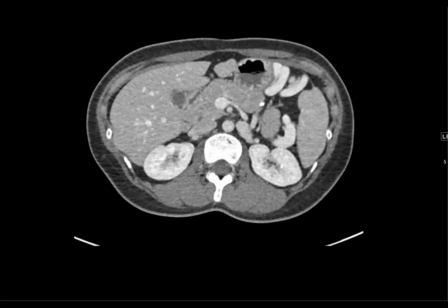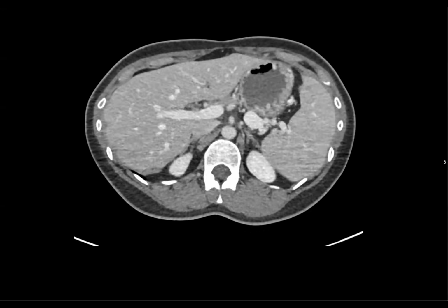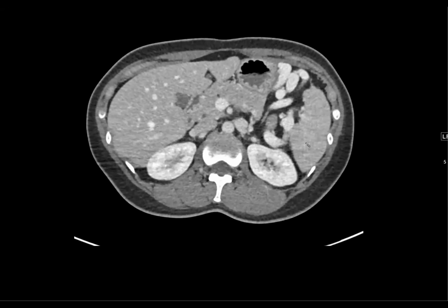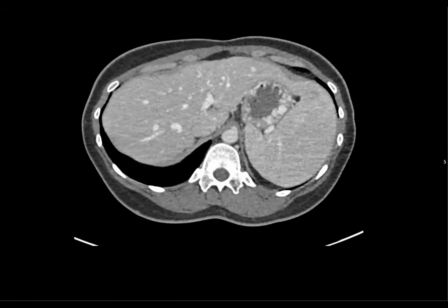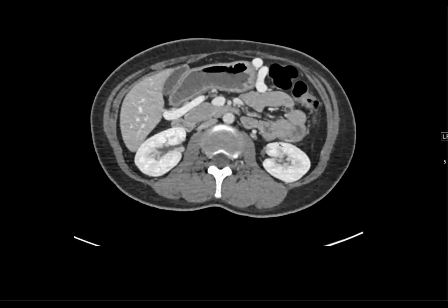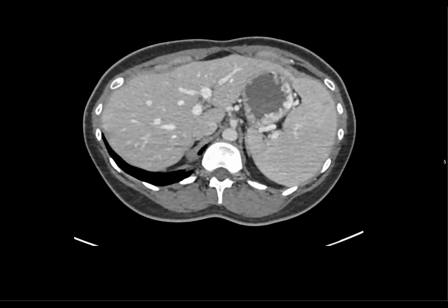Yes, I think so. Generally, if they're doing a distal pancreatectomy for a malignant process, they will remove the splenic artery and vein and therefore the spleen. But if they can leave the splenic artery, which they have here, they can spare the spleen. So I guess your question is, should they have taken the spleen out so we didn't get these big collaterals and just deal with that? Yeah, that's a good thought. My concept of it is if you're going to leave the spleen fed by an artery and you're going to take away the venous outflow, this is going to happen. Yeah, that's a really good thought.